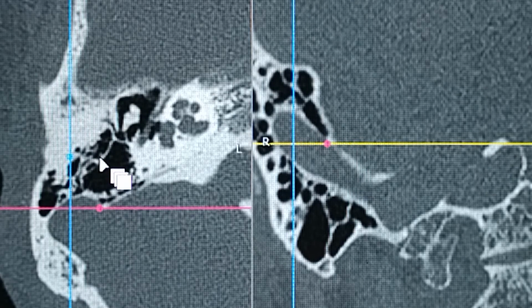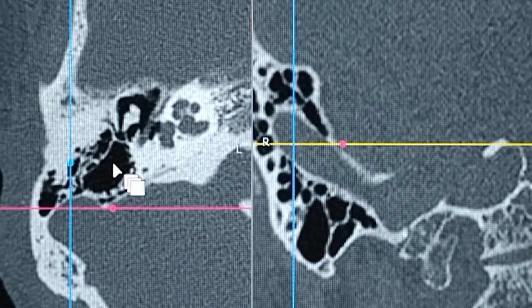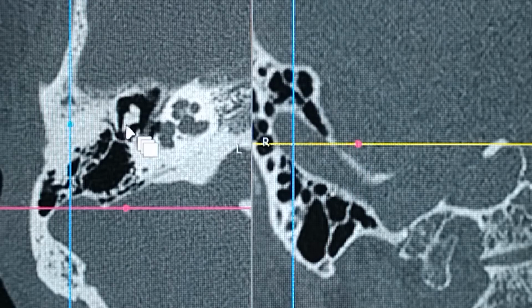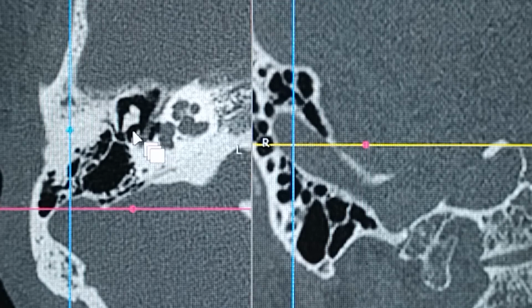So the clinical significance is that in cases of chronic mastoiditis, or you can say cholesteatoma, this entire thing is filled with the disease. You have to open up these periantral cells. Then you open up the periantral cells, you come from here, you dive into this area, and then slowly you achieve the patency from here, and then you can see the glimpse of the short process of the incus through that opening in the aditus. And then if the ossicles are diseased, you take them out and you refashion them, you reshape them, and you form an ossicular continuity eventually.